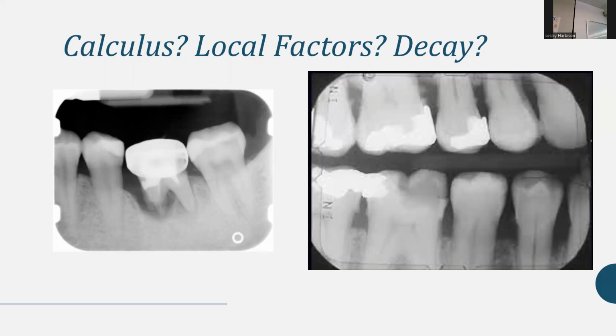But if the bone loss stops here, then you're talking about it's at this level on this side of the tooth and it's gone down to this side. I wouldn't test you and throw that in a test because that's a little tricky. I see what you're saying, but it's always comparing one tooth to another. And is it higher on one side and lower on the other tooth?